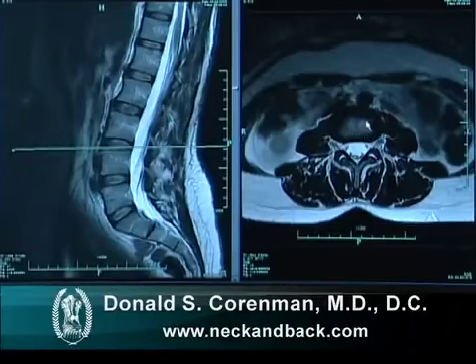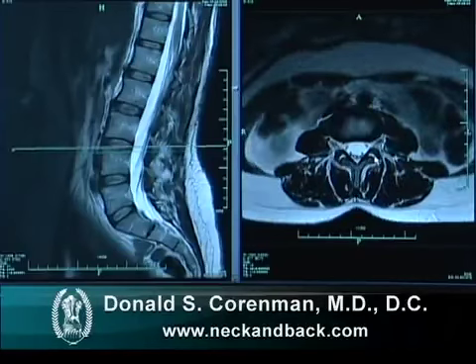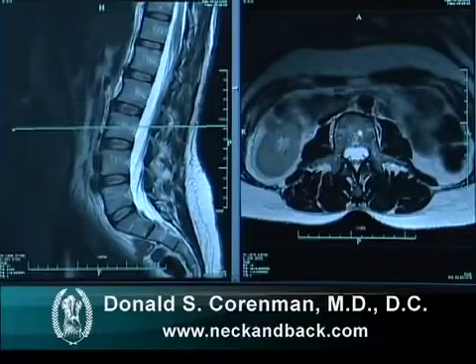We can march up then and go to the next level at 3-4 and again see the same thing. The jelly-filled donut, the outer plies of the tire, the sac of nerves. If we get a little higher, we can see the actual facet joints, and this is a normal level. We can continue to go up and see more. Here is the basivertebral vein and some of the veins within the vertebral body itself. So when you look at these images, these are normal.